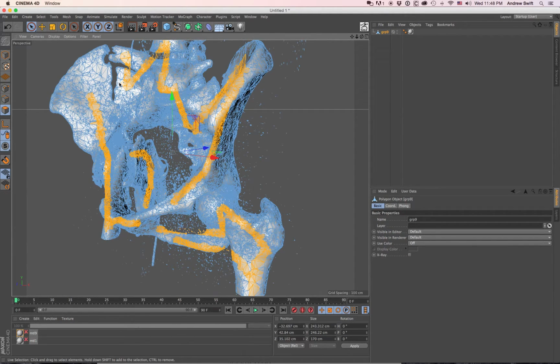And now I'm going to do UW, which is just going to select the contiguous polygons that are connected to those. In other words, this noise out here doesn't share a polygonal edge or a point with any of the ones I selected, so they will not be selected. So then I can invert the selection and hit delete. And this does take a while. This is probably the most time intensive part of the process.